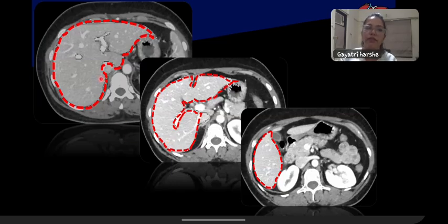Now we will see how we can do the volumetric assessment by the manual way. So what we take here is the hepatic venous phase of CT axial section, then contour the liver from its outer margin, exclude IVC, exclude portal vein and this visceral fat as well as gallbladder. That will not be taken into account in these markings.